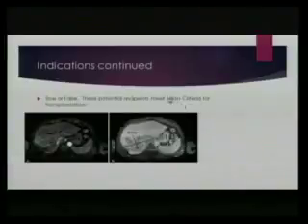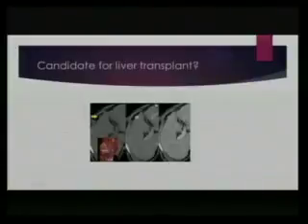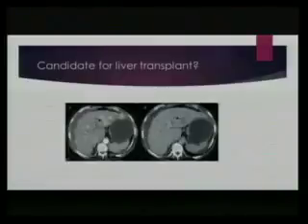Okay, so I don't want you to spurt out why you're answering the way you're answering, because we'll go over the Milan criteria shortly. But looking at this image, is this patient a candidate for transplantation? Second year? Okay, just stop at no. Okay, another second year. Yes or no? Yes. Okay. Yes or no? I don't care who. Yes? Okay. So the answers were false, true, false.